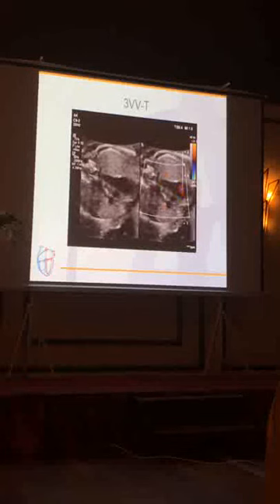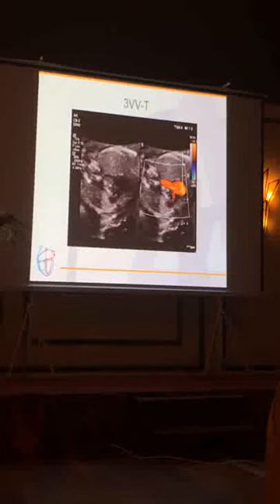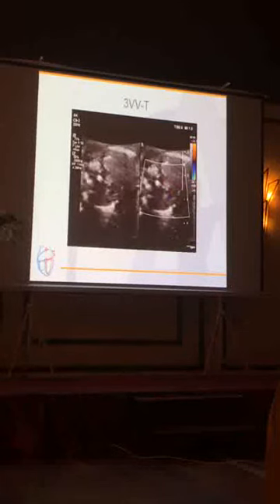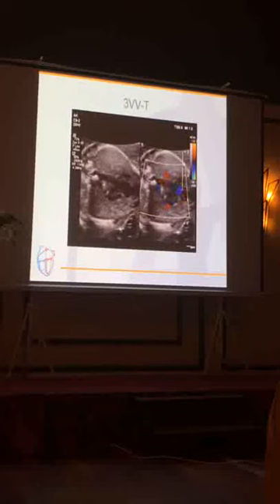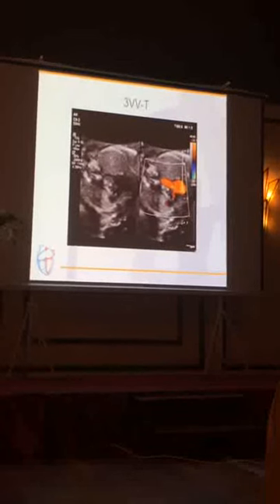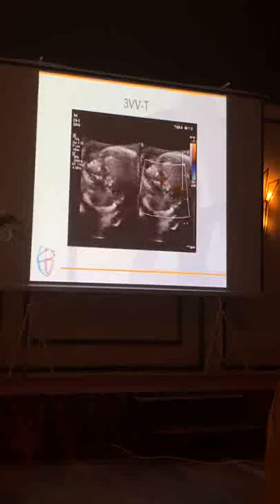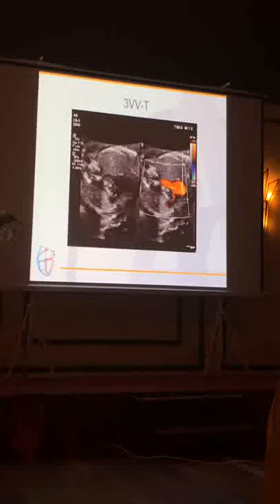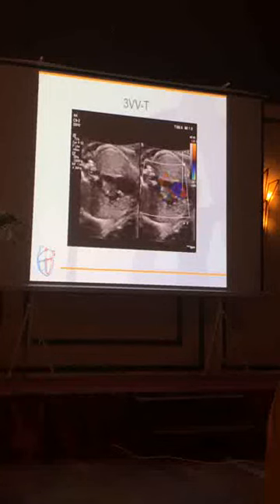And what are your options? Aortic coarctation or interrupted. Yes, so it could be a coarctation with a very, very thin arch, because sometimes it's difficult to see, and it could be interrupted. Sometimes it's quite difficult to differentiate if it is really interrupted, or it's just very, very tiny, and you can't see it.